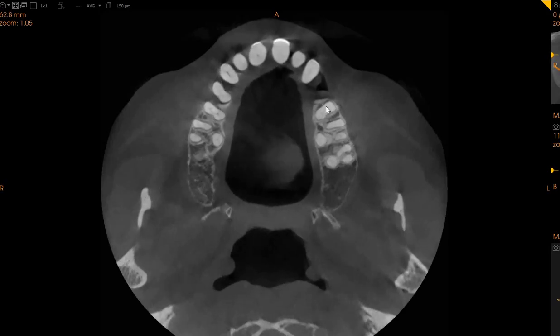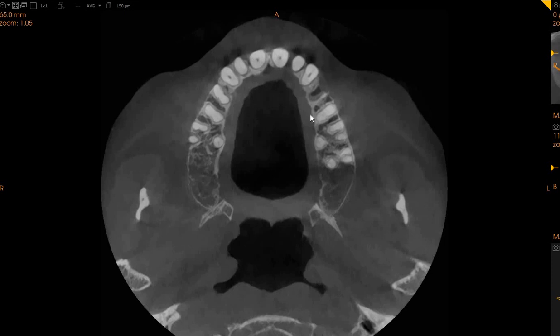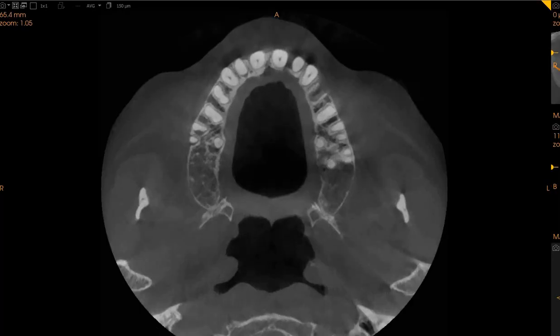So hence our advice, we have mentioned the situation of the tooth, and we've also mentioned how this tooth, even though we feel like there might be some either graft material or bone material, there is loss of buccal plate, so the doctor might have to reconstruct the entire buccal plate.